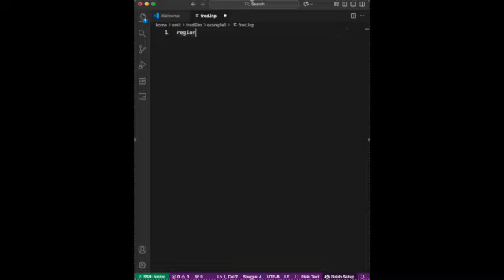What I'm trying to do, as in my previous video on FRED, is coding FRED. FRED stands for Fast particle therapy Dose Evaluator, and it runs on GPU, which makes it faster than CPU-powered Monte Carlo engines. That is the flagship thing about FRED, being fast. Now I am going to show you how to run a simple single proton beamlet in a water phantom and evaluate the dose.